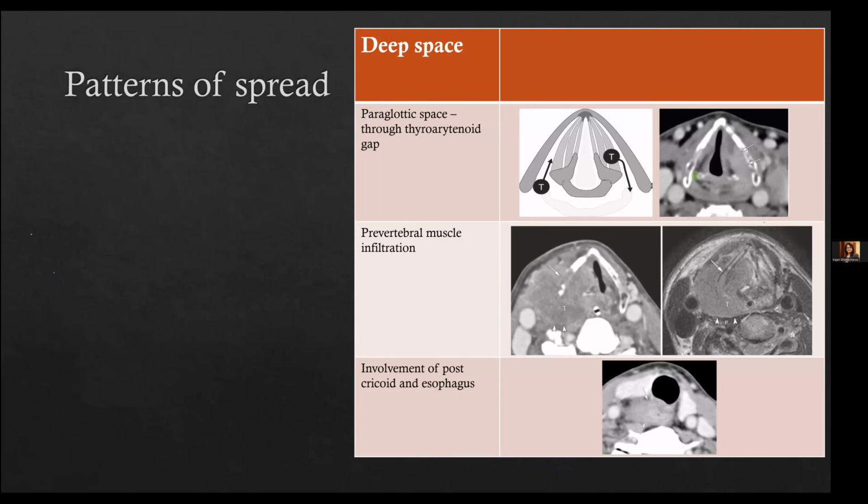Most of the times, wherever the bulk of the tumor is, that is the most necrotic part of the tumor, because it starts in that region and starts necrosing in that region because of the growth of the tumor around it. So wherever is the larger, most bulky and necrotic part of the tumor, there we should consider as the epicenter of the disease. The rest of the disease which starts growing in the periphery is a more vascularized part of the tumor. Therefore, it's less bulky and more vascularized, so there is less necrosis. So the thickest part of the tumor and the most necrotic part of the tumor is the epicenter.